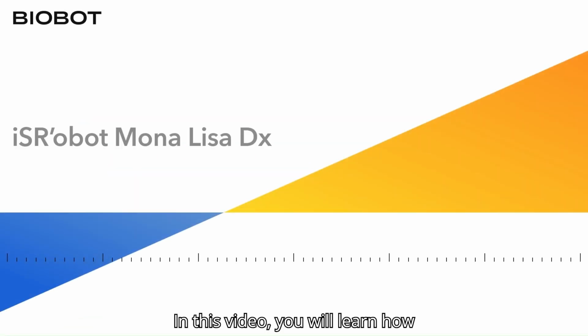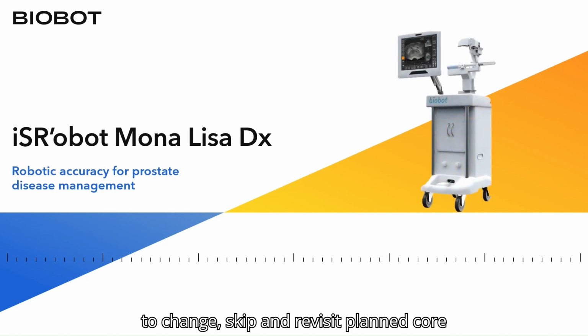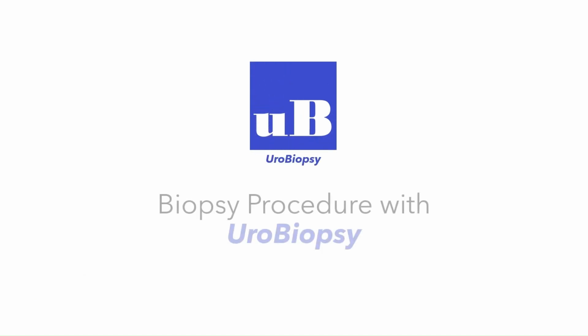In this video, you will learn how to change, skip and revisit planned core positions, conduct needle deflection adjustment and patient movement adjustment.